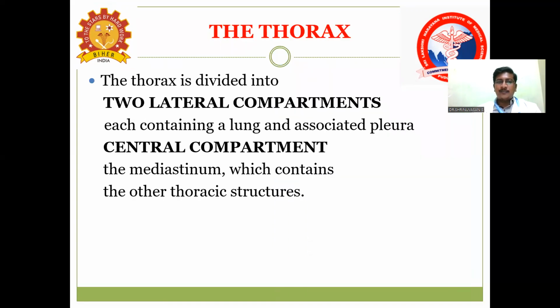Then we will go to the thorax, that means radiographic anatomy. So far we have seen what we mean by the X-ray, then the different views of chest X-ray. Then we have seen how to assess the technical factors, whether they have taken the chest X-ray properly, that is rotation, inspiration, and penetration, RIP.